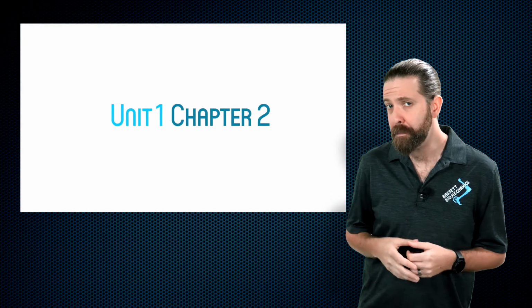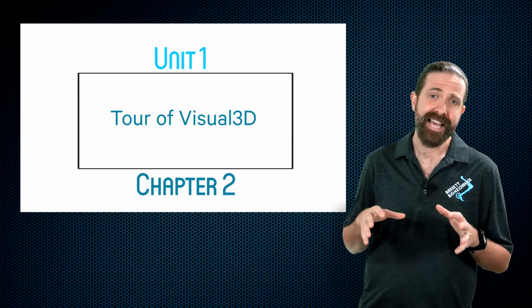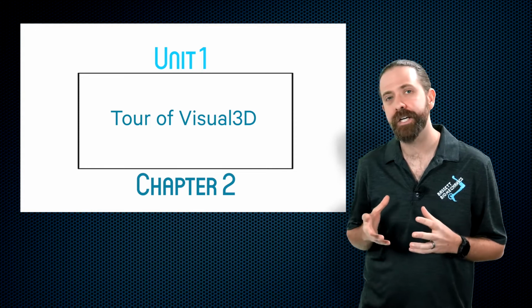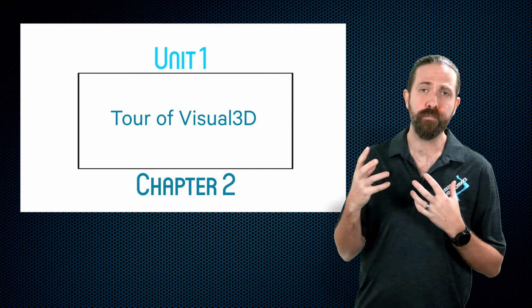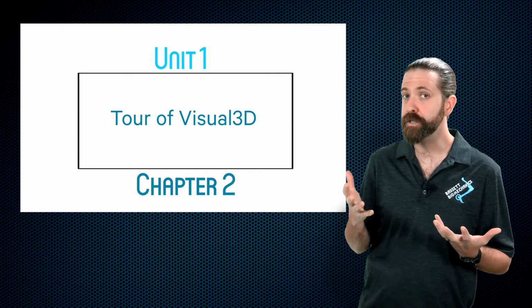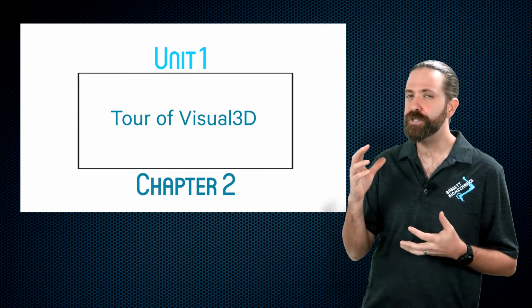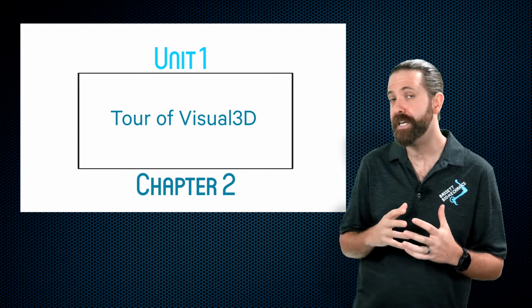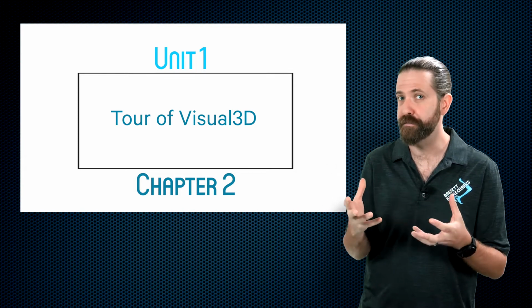Hi, and welcome back to Visual 3D Basics. In this chapter we are opening Visual 3D for the first time. We just want to give you a brief tour of what you're seeing and what it's for, so that you know what to expect later on when we use various features in the various parts of Visual 3D.